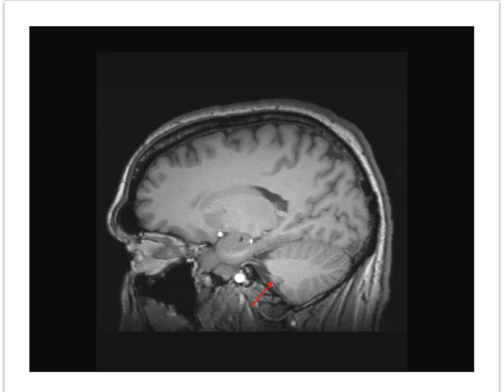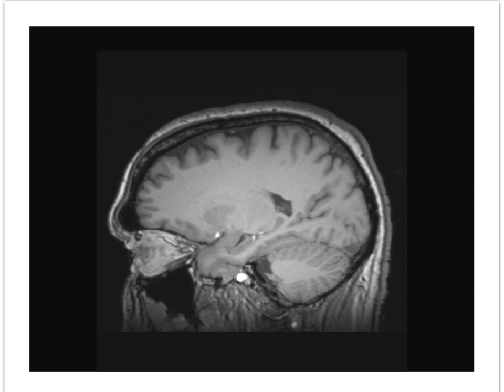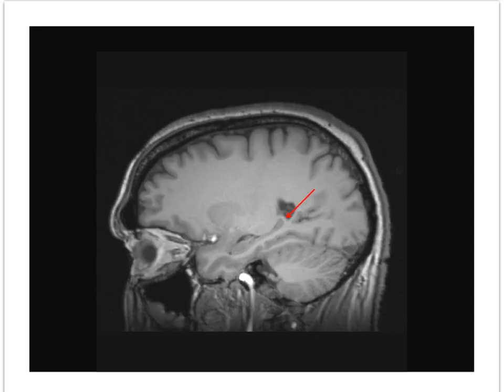This is the small flocculonodular lobe of the cerebellum. Again, we can see choroid plexus, which produces CSF within the atrium of the lateral ventricle. This arrow points out the crus of fornix, and this arrow points out the curve of the internal carotid artery as it enters the skull base.